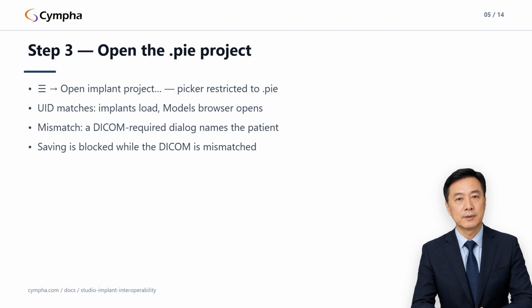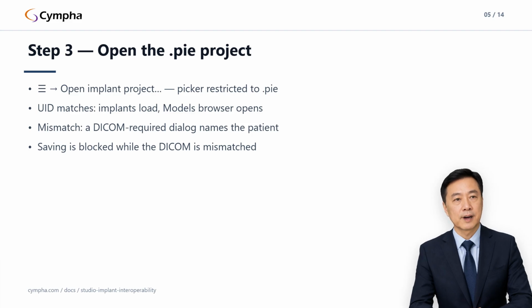And note the guardrail: you cannot save implants back to the project while the DICOM is mismatched. Studio blocks the write on purpose, so a plan can never be silently re-anchored to the wrong scan. Before you change anything, understand what your colleague built.